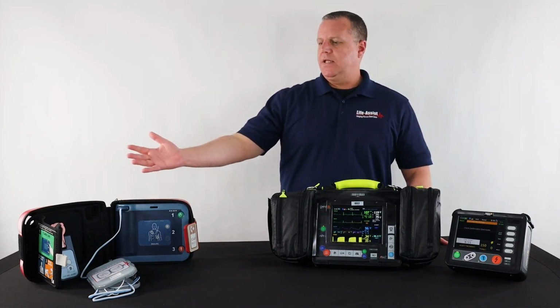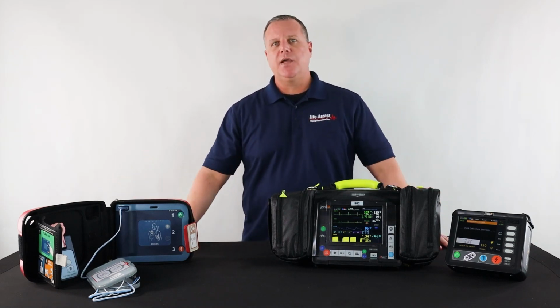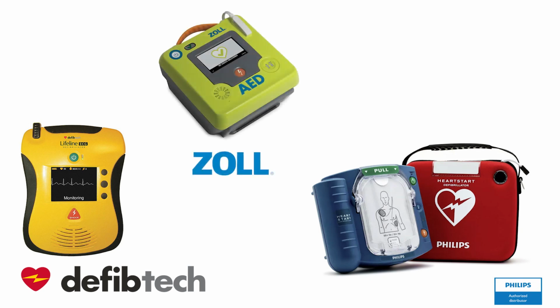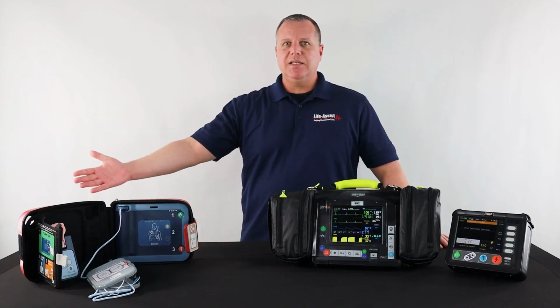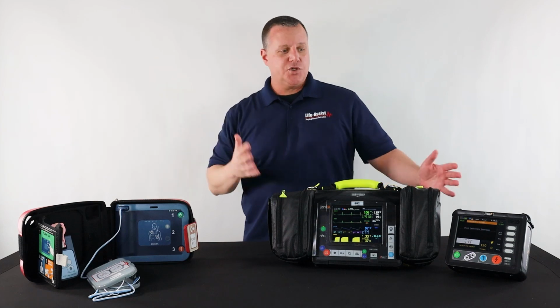Who makes these AEDs? Well, there's a lot of manufacturers that make them. The ones that we sell here at LifeSys that we pretty much display on our website are going to be Philips. Philips has a few models. There's DefibTech. DefibTech has a couple different models. And then there is also Zoll, who offers some other models as well. Okay? So that's how simple it is. This AED has one job, and it does it very well, and it definitely can save lives. Okay, let's move on to the cardiac monitor.